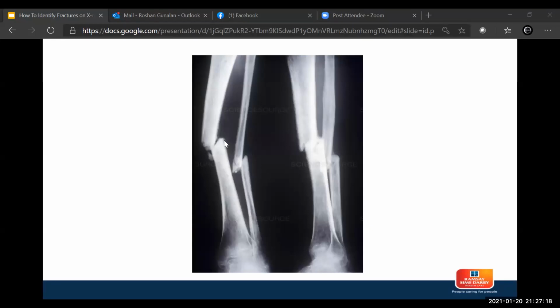Yeah, so it's a mid-shaft fracture, transverse, slightly oblique, comminuted. There is angulation of both the bones, the distal fibula and the tibia. And this is what I meant about the shortening. You notice the fibula looks shorter. It's not really a shorter bone. It just looks shorter because there's an overlap there, yeah? Because of the tibia angulation, this fella has overlap there. So just to get the hang of this, that's correct. Most people got it right, yeah?